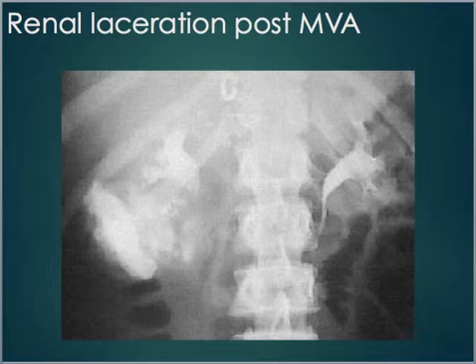This is a laceration from an MVA. So you can see here how all this contrast is contained inside of the kidney. You can see nice sharp lines here. Over here you can see where the outline is, and then how it's starting to flow out of the kidney here, almost like into a blob. That kidney was lacerated, and the contrast has flowed out during the procedure.